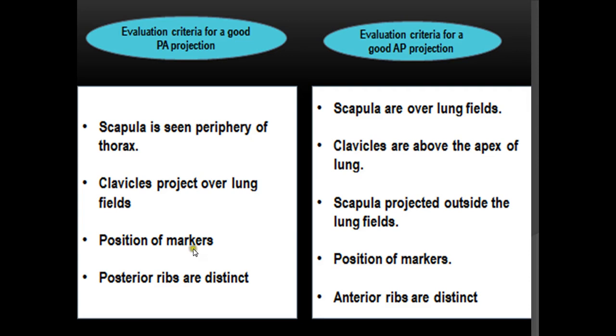Again, the position of the marker is very important to see. Always check whether it's an AP projection or PA projection. It's always mentioned. Sometimes the position of the markers can be wrong; technicians can mistakenly put these markers, but you have to be very conscious all the time.